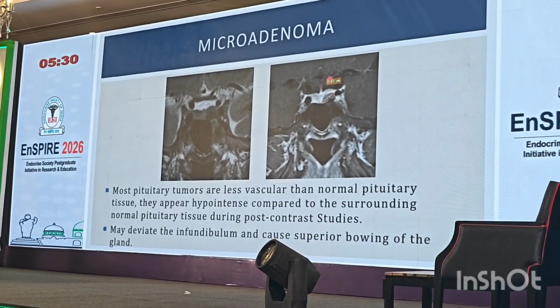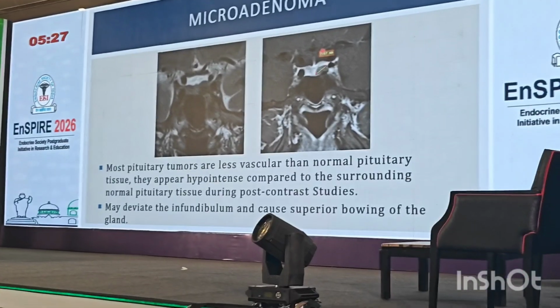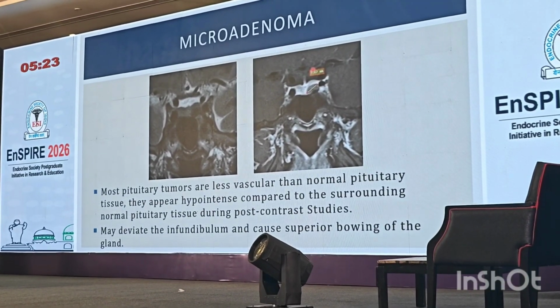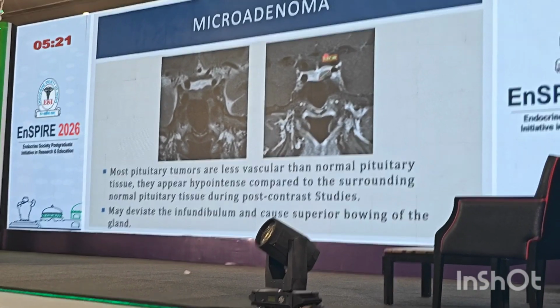It may deviate the infundibulum and it may cause a superior bulge. So those are clues on the plain scan itself which you can suspect, and then you can go for the post contrast sequences.